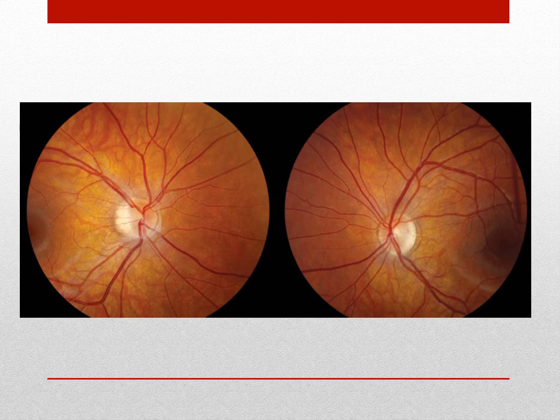So here we're seeing a fundus photo. Again, it's the right eye and left eye. Looking here at the optic nerve, you can see that it is tilted. Follow the blood vessels here, you can see that it's kind of dragged, straightened. Here is a flat portion of the optic disc with that scleral expansion or a myopic crescent. So this is definitely a myopic fundus. And the same thing you're seeing with the left eye, that myopic crescent.